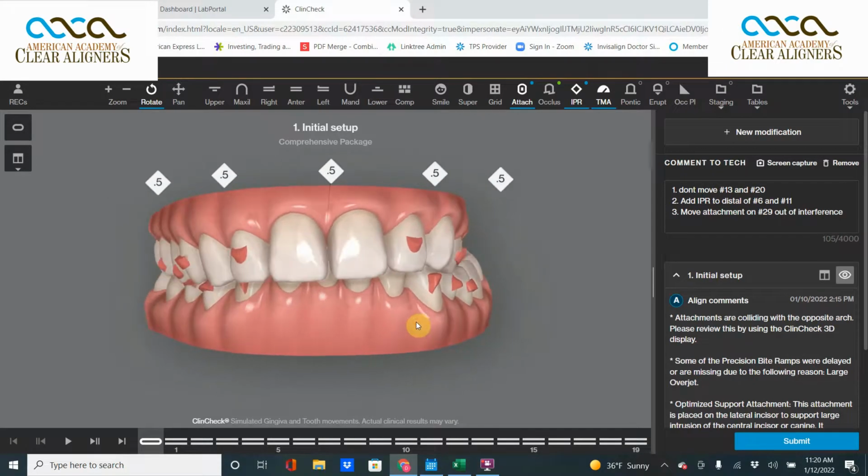Today is the most important Clincheck Theater Thursday of the year. These are the three top modifications that I make to my Clinchecks every single time. There are three tiny little glitches. GLR is almost perfect, but there are three little nuances that crept into the code in the last 2 months because of changes that Invisalign made to the overall scheme.